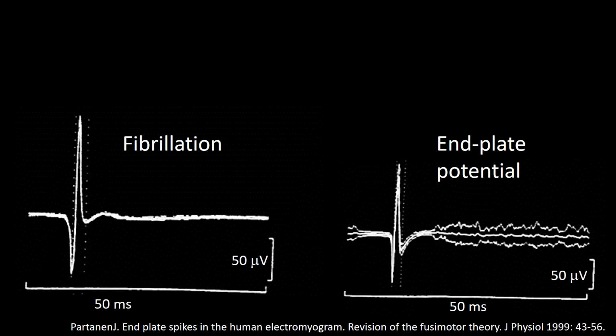Now let's look at the second finding that distinguishes fibrillation from triphasic potential present in our examples. This finding is based on the same principle that supported the first finding. The finding is that the interval between initial baseline departure and maximal positivity lasts longer in fibrillation potentials than in end plate potentials. In this frame, I have added interrupted lines demarcating these landmarks. And as you can see, the end plate potential interval is about 1/5 shorter than the fibrillation potential interval.